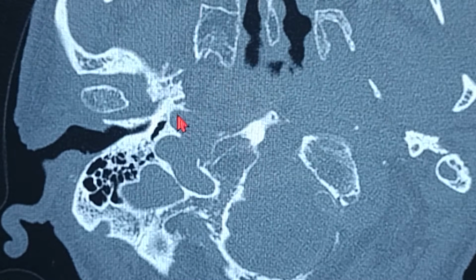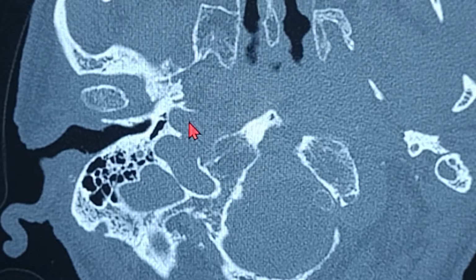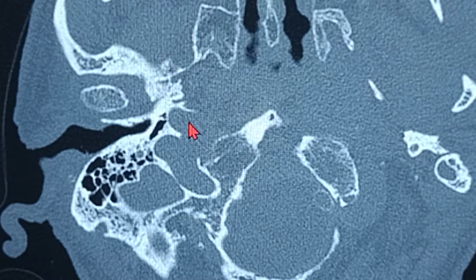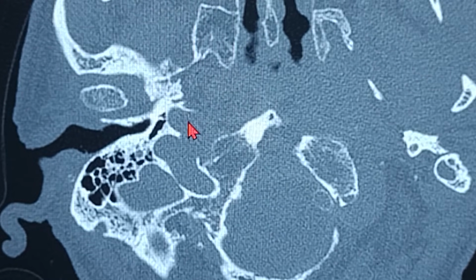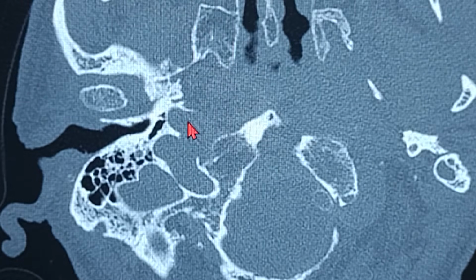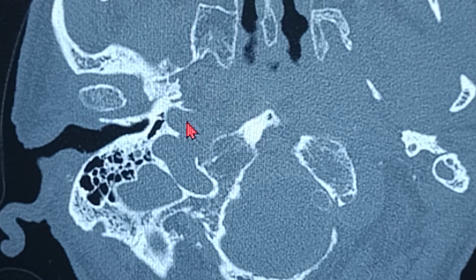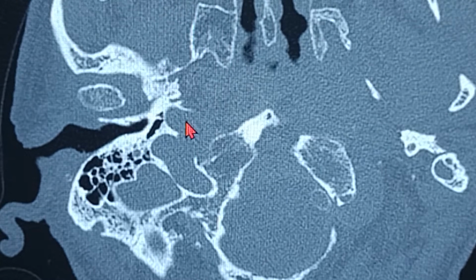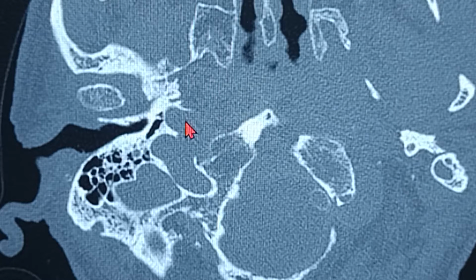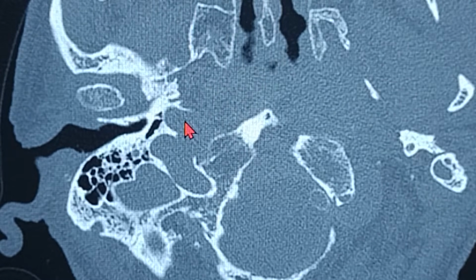So this is a place where I can start seeing the internal carotid artery. It is the place where the artery is entering vertically from the neck, that is the parapharyngeal area, into the skull base. Okay, so we all know that the carotid artery has different routes, and I've done a video on the course of the internal carotid artery. So the very first part being the cervical segment, it exactly vertically ascends upwards into the carotid sheath along with the IJV and enters through the skull base, that's the carotid canal.